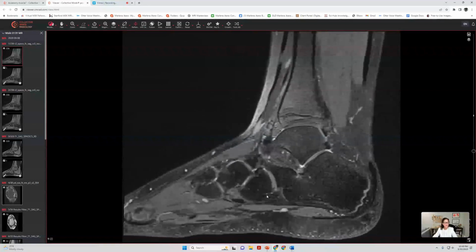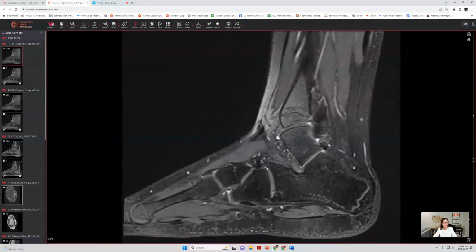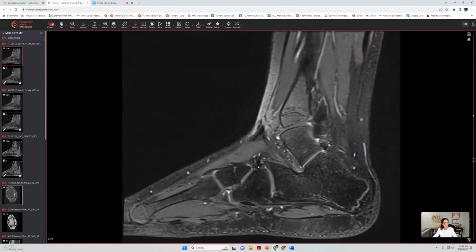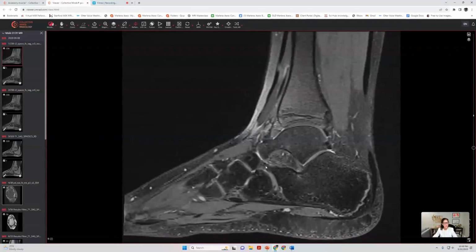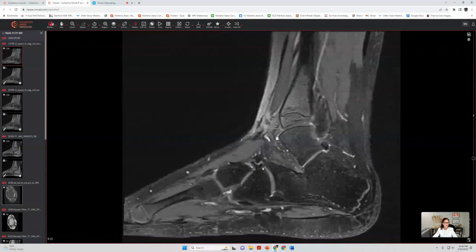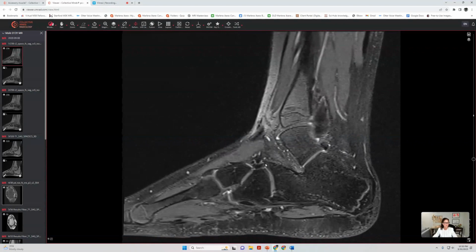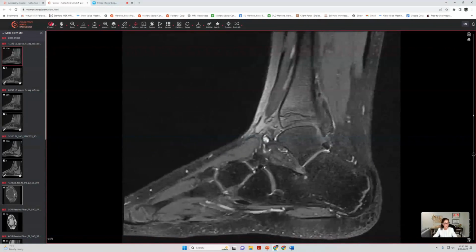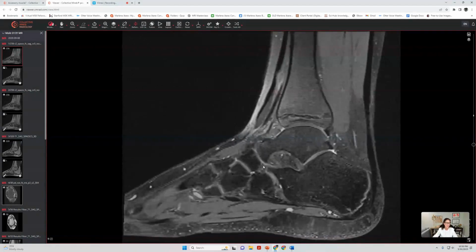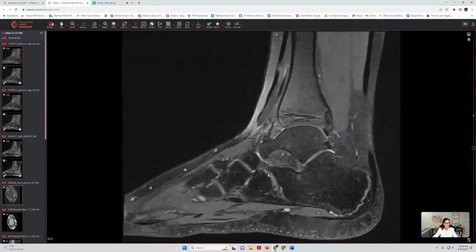Now let's take a look at some of the structures, called the bifurcate ligament. That's also known as the Chopart ligament, that I think you can see very well on sagittal imaging, where the calcaneocuboid, very thick ligament, and also ligaments go from the anterior aspect of the calcaneal process towards the talus and navicula. So furthermore, this bifurcate ligament, very strong ligament that is attached here, not only supports the calcaneocuboid lateral column, but also the medial column through the connections at the talonavicular articulation.